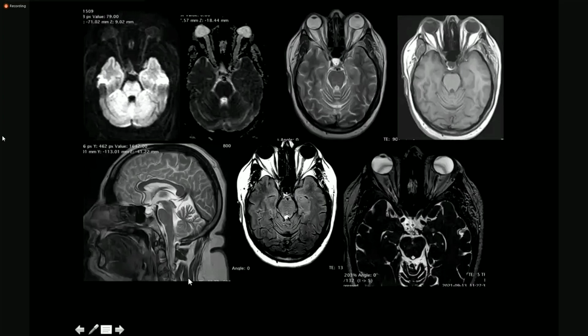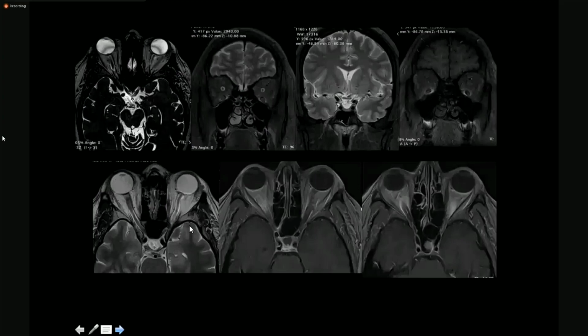So this is basically a case of benign intracranial hypertension, which is idiopathic in obese females, especially from 18 to 45 years of age. It is 1:8 times male to female ratio. And the patient presents with a severe headache. There is swollen optic disc head. There is restriction in the optic nerve. There is increased perioptic sleeve. There is empty sella. There is thinning of the ventricles, slit-like ventricles. These are all very subtle features.